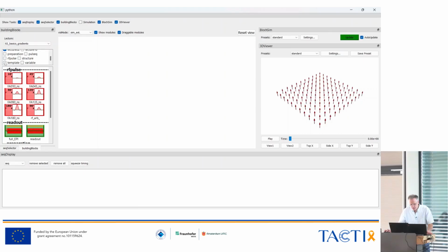Those are the base elements which I use. So if you very eagerly want to control everything, as I typically like to do, you can go to those templates and modify a lot of different things. It might be too much. That's why I went back to those predefined pulses to make it a little bit easier for you, just to let you know.